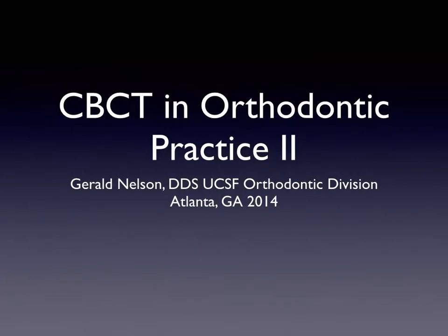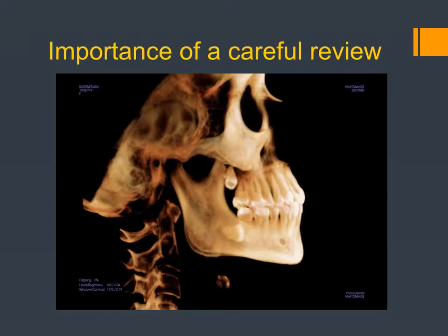We discussed in part 1 CBCT in orthodontic practice, and I want to continue this topic. In the second part, I will review some of the clinic cases from our clinic. One of the things we talked about is that your radiology technologist can present to you some static images that help you in your diagnosis, but I also emphasize that doing a clear review of your images is really important.